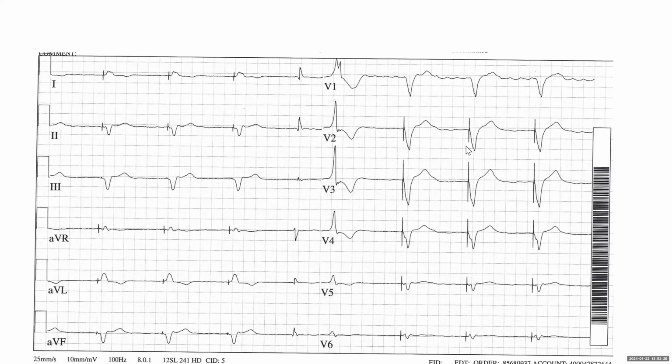Okay, good. So atrial fibrillation, ventricular pace, single PVC, left axis deviation, non-specific STT changes. Agree. And Abdulaziz, my go-to quote. I think this is a smart way of doing exams.